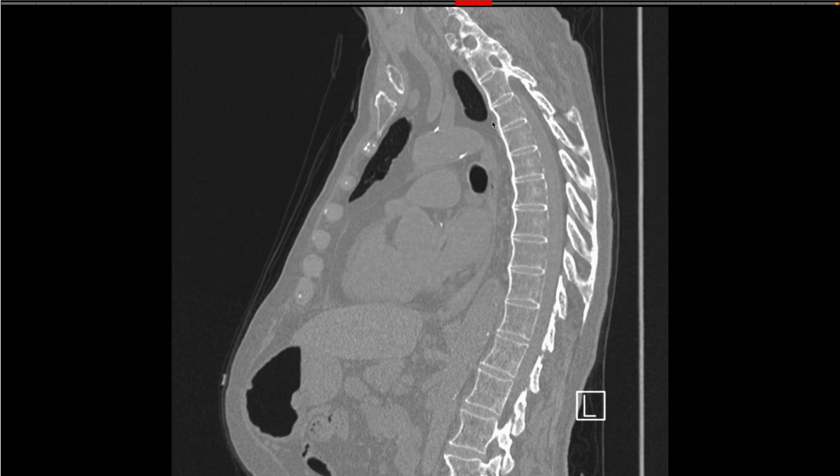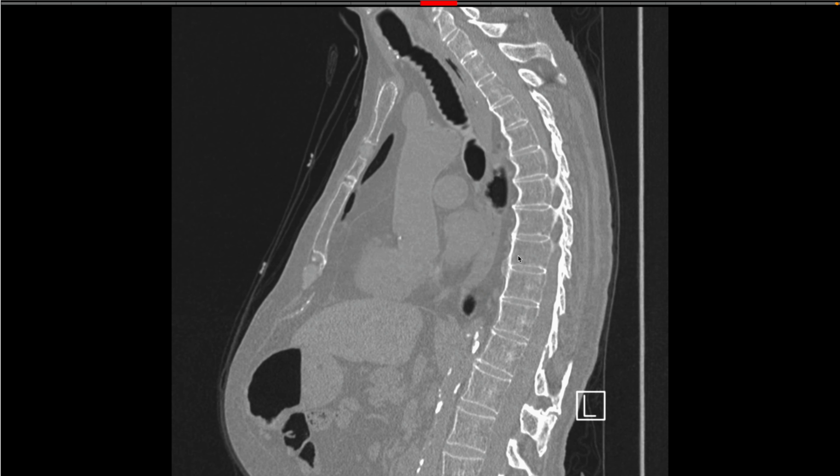That's the ALL, and it's fine ossification. It's syndesmophytes flowing up. It's not your flowing ALL ossification that you would get with DISH.